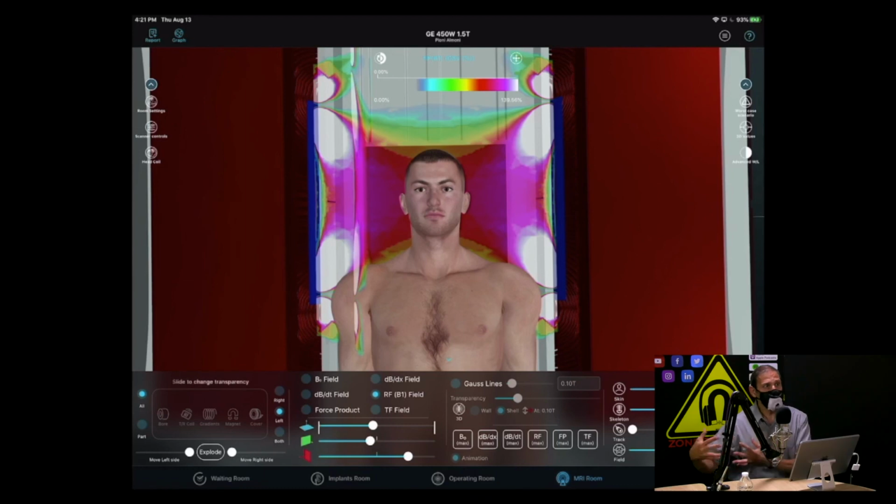So we know that, and we use population norms for how we change the magnitude of that patient's fat distribution, and it'll use that to help guide you and perhaps warn you this patient is going to be at a greater risk for a certain type of burn or maybe too large to fit. Once the data is there, there's almost no end to how you can apply it to more efficiently and safely scanning your patients.